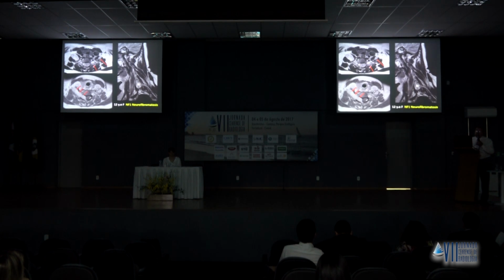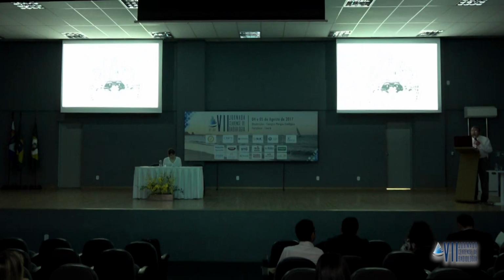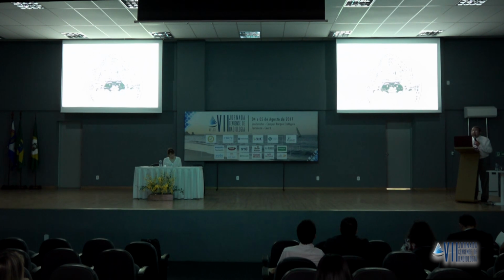Here is the anterior scalene, here is the middle and posterior, and a dumbbell-shaped lesion going to the neuroforamen on that side, another lesion here, and at multiple levels you had multiple lesions. And again, you locate this tumor in the scalene triangle. Here's the anterior scalene, middle scalene, and right at the bottom will be the subclavian artery. One important feature is that the longus colli, longus capitis are displaced anteriorly, okay?